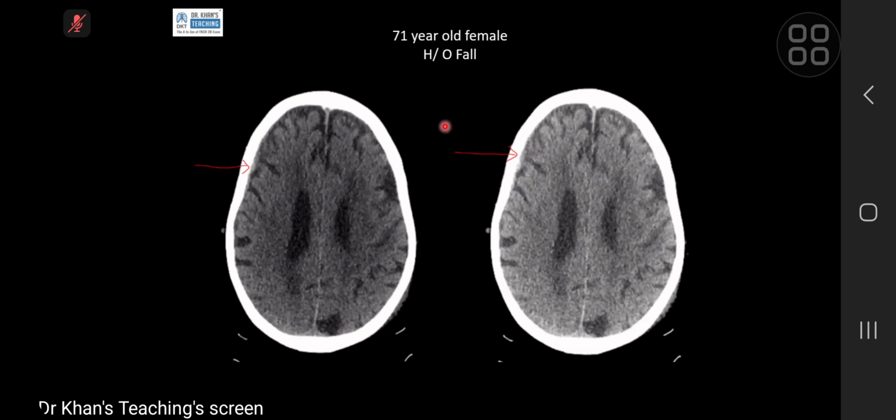Then in transtentorial herniation, this is an absolutely blatant case. Basically, the medialmost portion of the temporal lobe herniates into the hiatus. In this case, it is sitting somewhere here. It has completely dipped, and that is why the midbrain is completely distorted. So this is the pons, and where is the midbrain? You cannot make sense. There is a bit of ambient cistern here. Where is the ambient cistern here? You don't see it. So the midbrain is completely compressed, distorted and displaced to the other side.